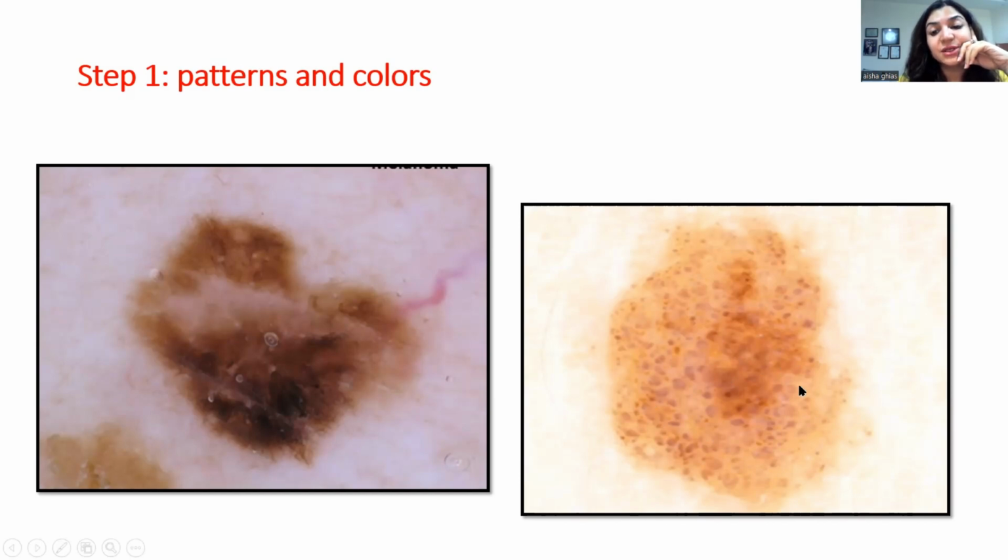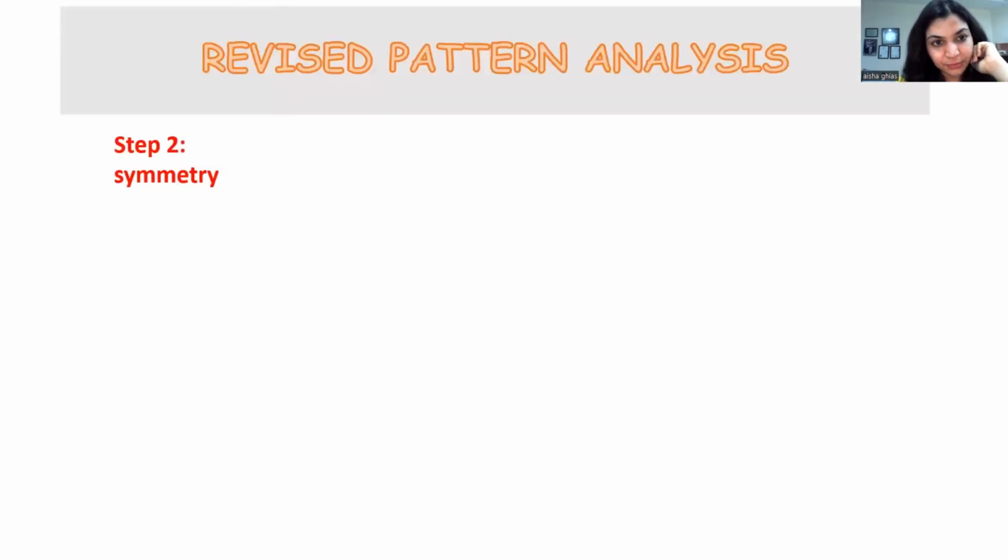However, if there is a recent history of change or the patient has some symptoms, maybe I would like to see this lesion after 3 months. And if the patient is very much concerned, I can also go for biopsy. So this is how you interpret the images.